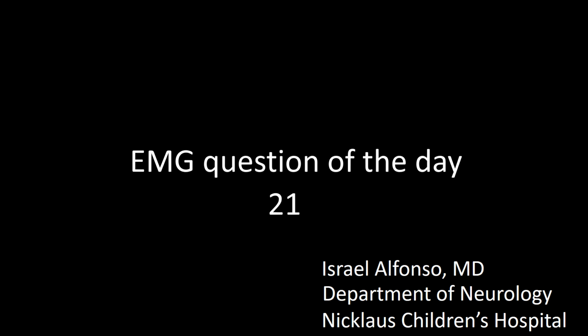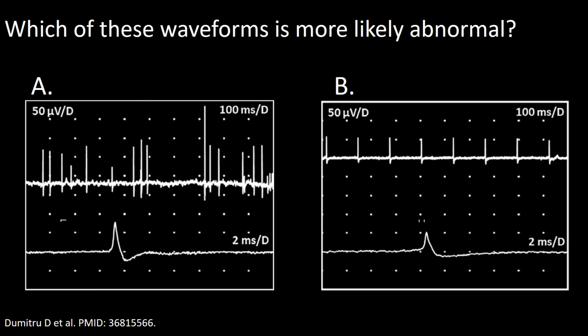EMG question of the day. Which of these waveforms is more likely to be abnormal? Please take a look at these figures and choose A or B.